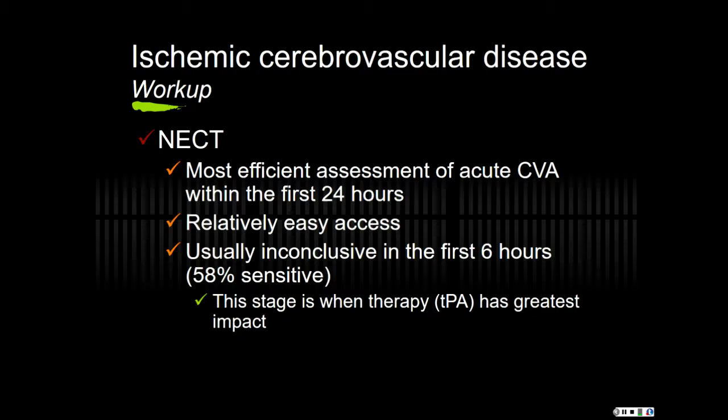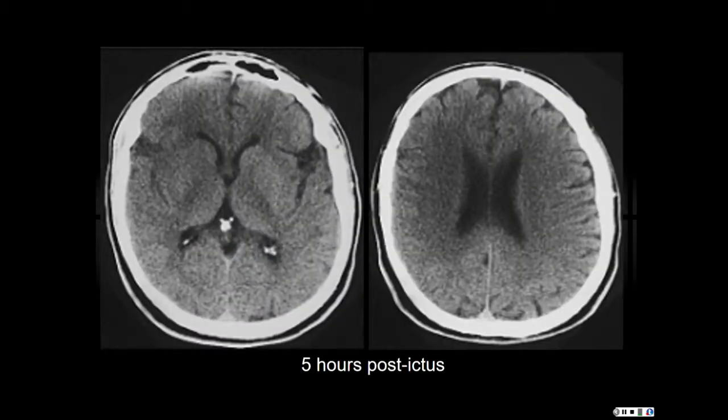I can't tell. They could be having a stroke without ischemia, right? Maybe they're having a seizure. I don't know. Anyway, this is an important slide. This is 5 hours after the patient started experiencing some symptoms. I have not shown you this case. This is, again, one of my favorite cases.